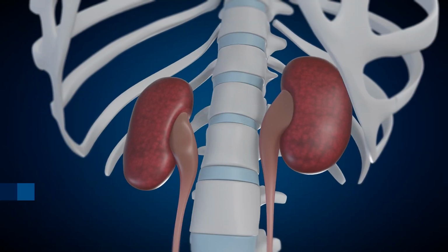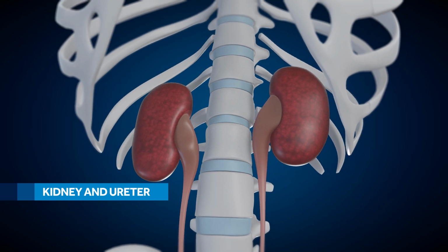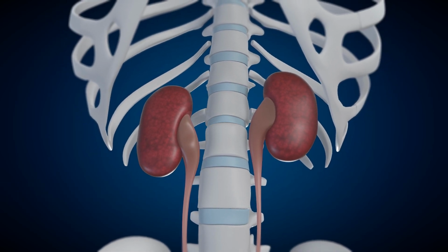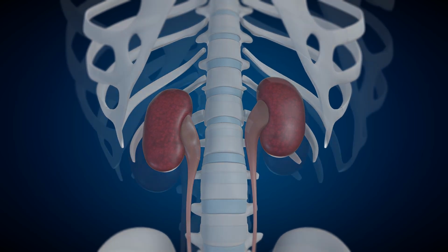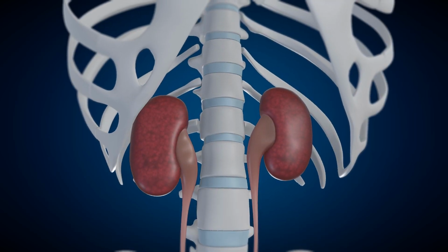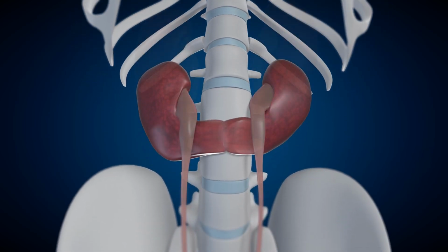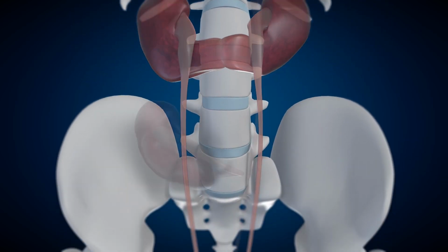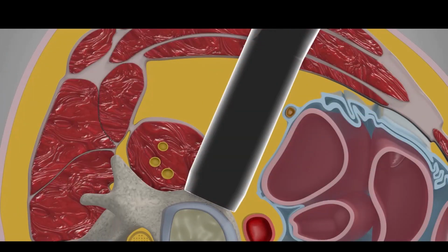Kidneys and ureters are part of the urinary system that delivers urine to the bladder. A concern for retroperitoneal procedures is location of the kidneys and ureter and potential injury. As part of preoperative planning, surgeons should evaluate for abnormalities of the kidneys, including a history of a kidney transplant, a horseshoe kidney, or a pelvic kidney. The ureter is usually attached to the peritoneum and will move anteriorly with the peritoneal contents as they are swept forward. Retractors may be used to directly visualize and protect the ureter.